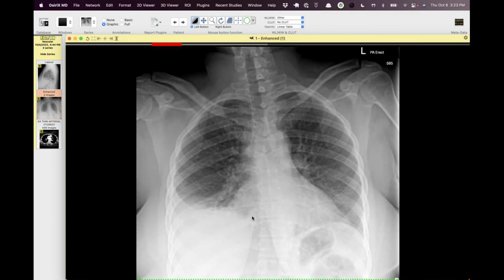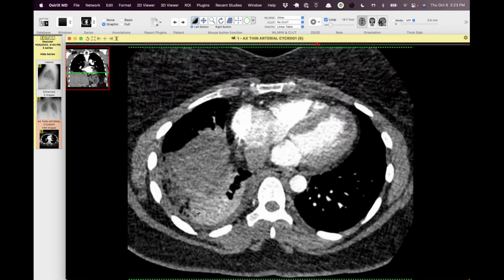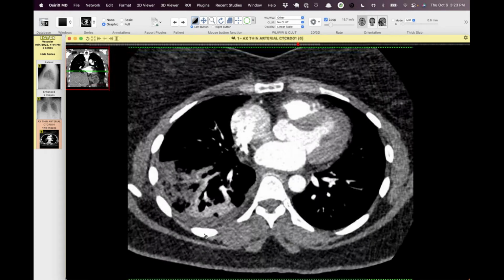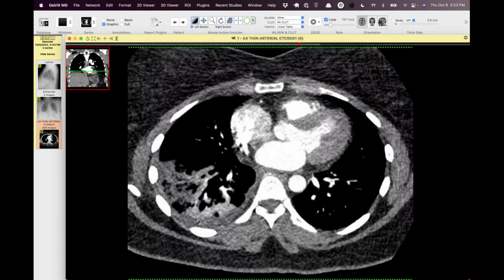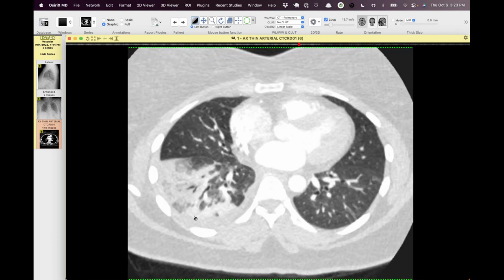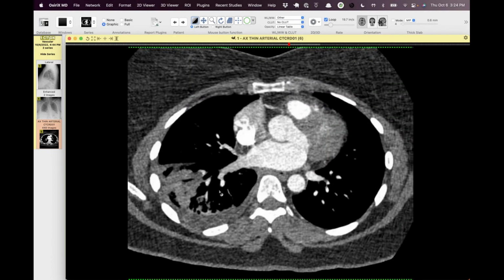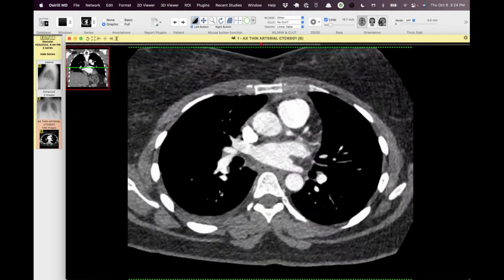Now this is just kind of a quickie, but a good example. This is a young patient in their 30s who has this opacity in the right lower hemithorax. They have acute symptoms. I think we'd call this pneumonia, maybe a small little parapneumonic effusion, assuming they have cough and fever or respiratory symptoms. For whatever reason, they went to CT, and I think the person interpreting this sees the effusion, sees the reduced area of enhancement, and just chalks this up to pneumonia with a parapneumonic effusion.